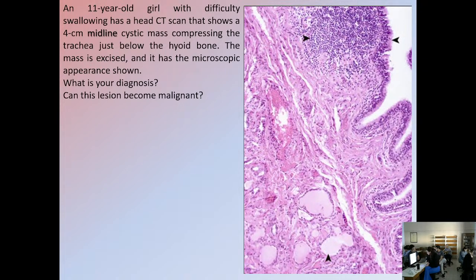What do you think? Is it squamous? No, it's not stratified. Cylindrical epithelium. It's the same as the upper respiratory epithelium. This is the common pseudostratified, cylindrical, or respiratory type epithelium. What else is there?